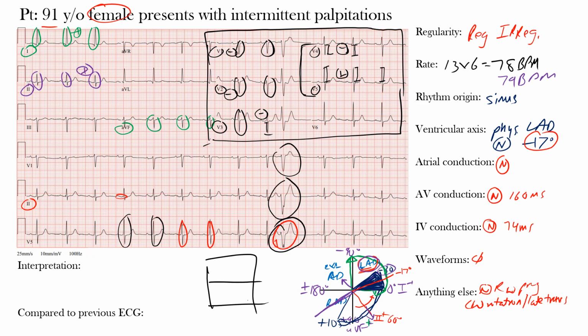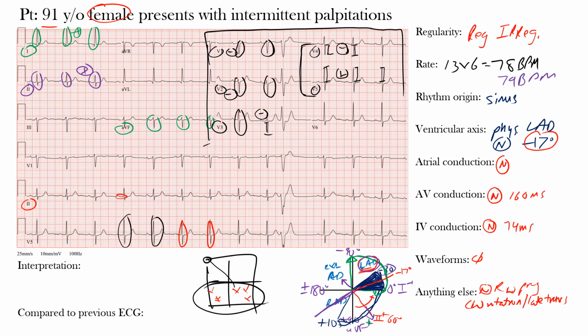So if we draw our system, remember these are our ventricles. Normally we start up here and come down, but if we're coming from some point within our ventricles, you have this ectopic focus, one of these that then fires, but it's outside that conduction system, and you have the slow cell-to-cell depolarization, and that's why you have these wide complexes that result. All right, so just to erase, you can see that these are all wide complexes, and notice that the beat is coming earlier than expected.